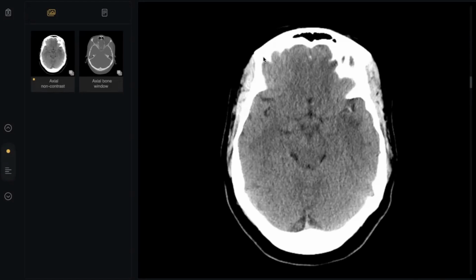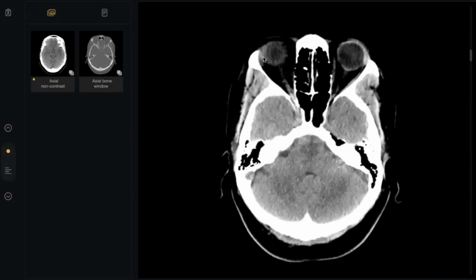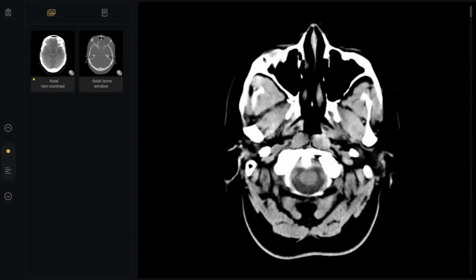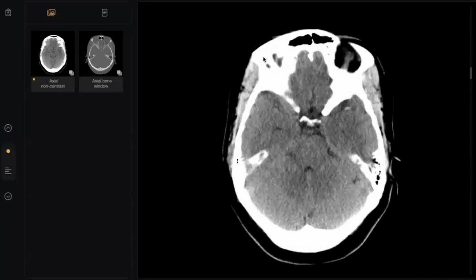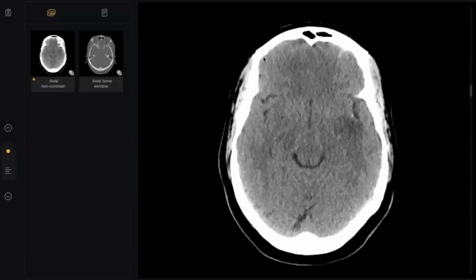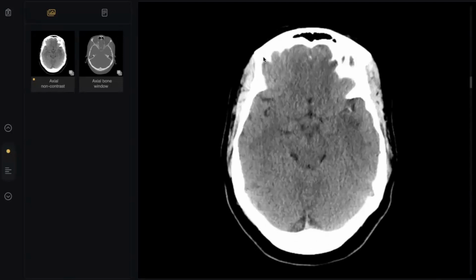Stop. Give me a differential. First, if you have a breakdown during the actual exam and the examiner is scrolling, ask him to scroll from the first slice to the last slice. After that, tell him the differential diagnosis and management immediately. So management, I will contact the neurologist. Doctor, you didn't give me a differential diagnosis. Give me the differential diagnosis.